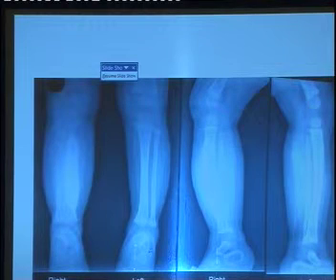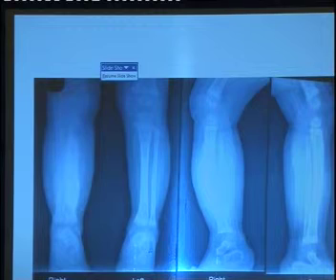Only a few days ago, I got a patient, only 6 months old, a child having this problem. There is a little bit of thickening of the soft tissues, the child was crying, and you see the tibia. What are the possibilities? What are the possibilities? One is definitely osteomyelitis. Anything? Not syphilis, I don't find it nowadays. I think you will not find it.